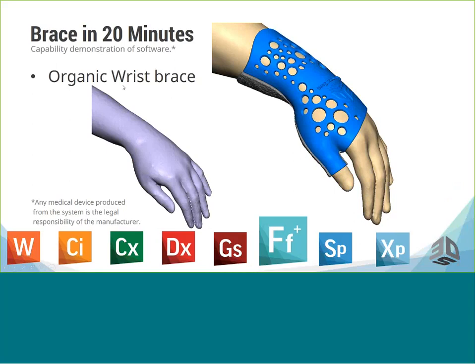Today I'm going to be demonstrating how to create a wrist brace. My start point is going to be CT mesh data, and I'm going to take that all the way to a completed product in about 20 minutes. So let's go ahead and get started.